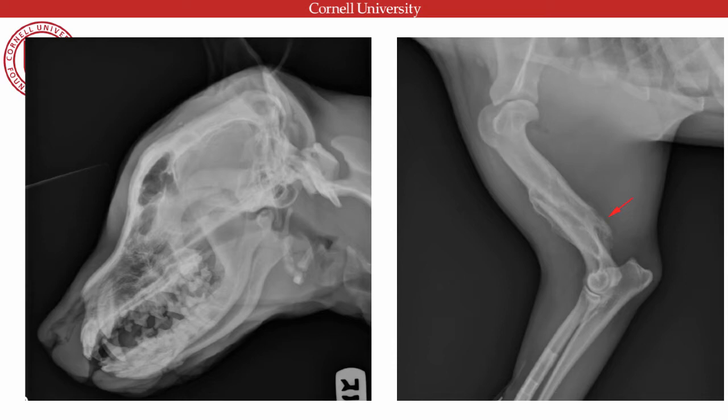And these guys have really good craniums. These bull terriers have, not like a Chihuahua or anything. They don't fracture easily, these guys. So as a response to trauma, her periosteum has become angry, and she's put down new bone, but she hasn't actually fractured from this. She has a fragment here, so she's probably chipped her calvarium at that level. But from this image, all I'm seeing is a periostitis dorsally.